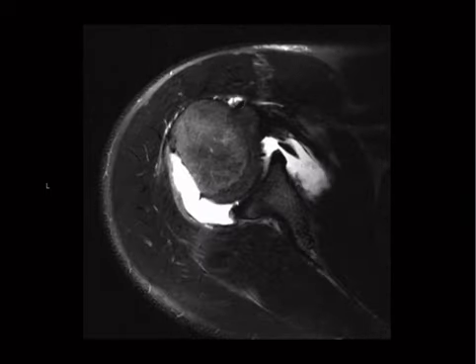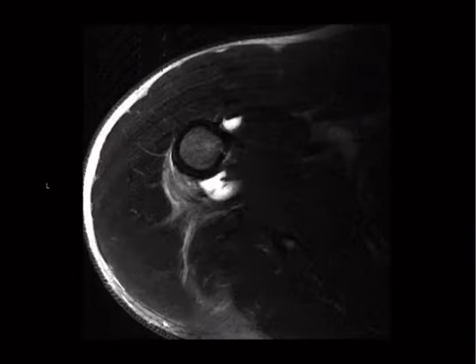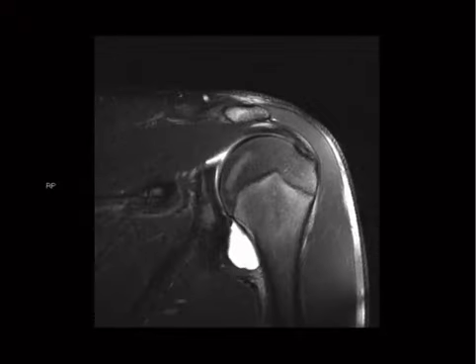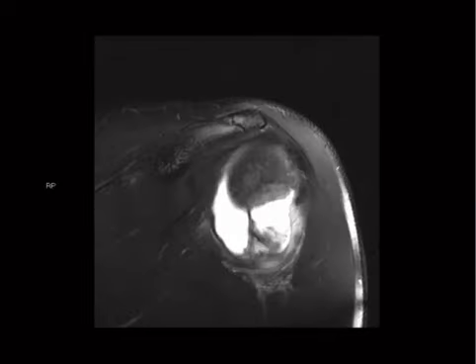Right here. That's what a HAGL is. Same deal here. See it? Go back. All this. Okay, see it now. All that.